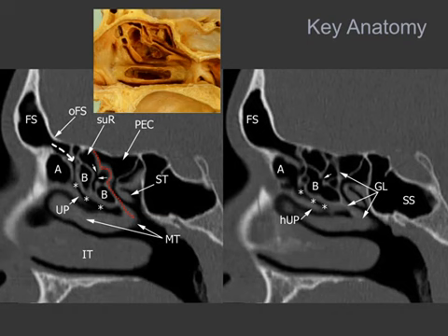What is also very important to note is that the path for the drainage of the frontal sinus will pass through this narrow recess that has a shape dictated by the competition between the complex of the cells of the ethmoid bulla and the complex of the cell in front of it, the agger nasi. It can be much more vertical or much more obliquely oriented according to the winner of this competition.